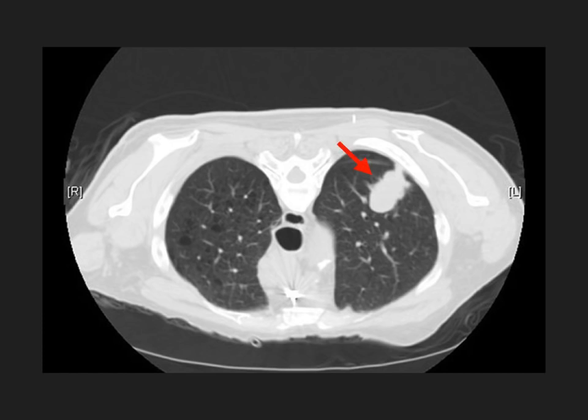Pause the video if you need more time, but right here we are pointing to a lung tumor. Now, I want you to know that lung tumors are so high yield on step 1. On my exam, I had at least 3 lung tumors, and if they're going to show you a CT scan, there's a really good chance that it's going to be of the lungs, because the lung is just really not amenable to a plain film when it comes to looking at masses. You could see an area on a plain film that could be a mass, but you really wouldn't be able to differentiate it from, say, a cavitation or maybe even a well-circumscribed pneumonia or a tuberculosis lesion. So if they're going to show you a lung mass, chances are you're going to get a CT.